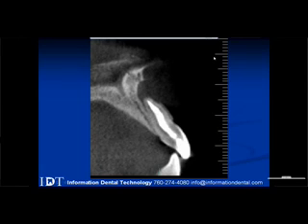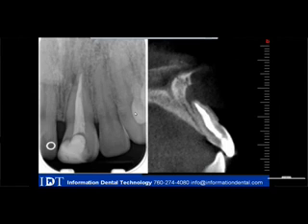So the probing depth was normal. That's why that was normal. But there's a really dense palatal plate, and that superimposes to the facial, giving you the illusion that there's actually bone there when there's not. So the cone beam is not as limiting as what you would get from a pano or from a periapical.